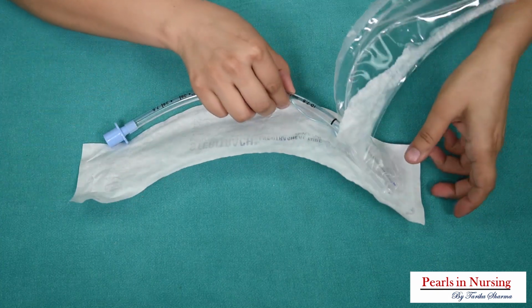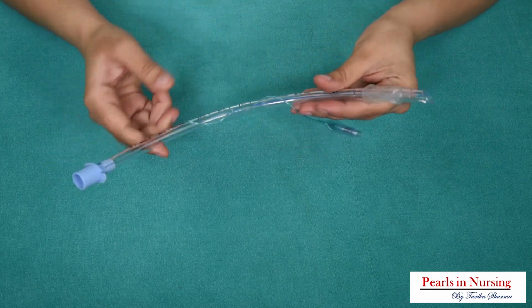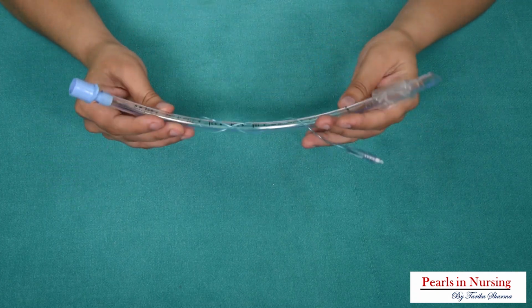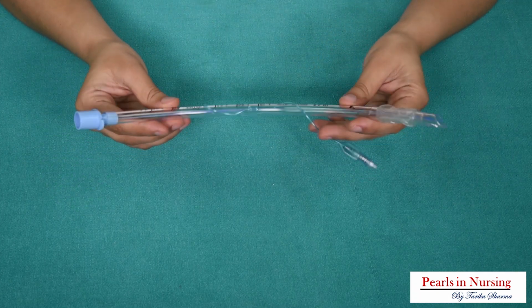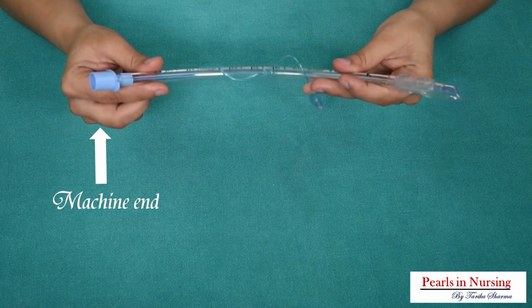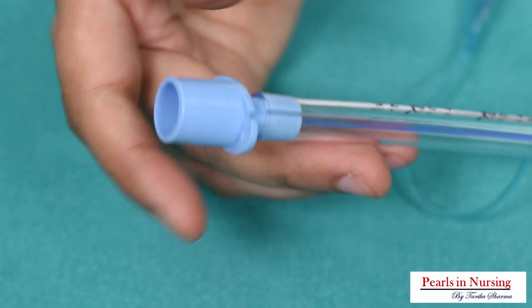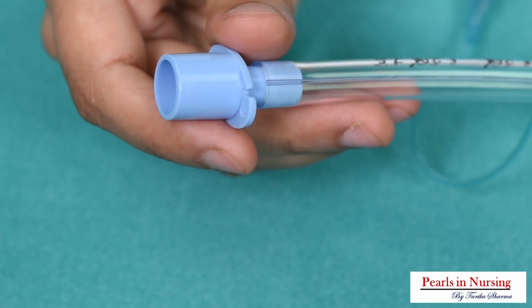Whenever we do the intubation and put this tube, it is always a sterile procedure. So, this is how it looks like. This tube is made up of PVC and this end is the tracheal end and this end is the machine end. So this end will go towards the patient's trachea and this end will be connected with the machine.